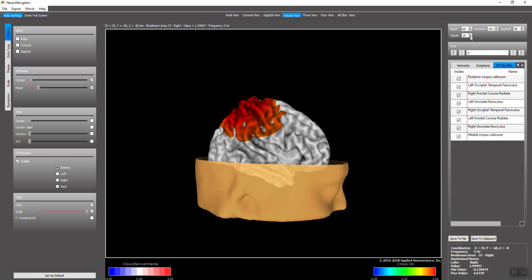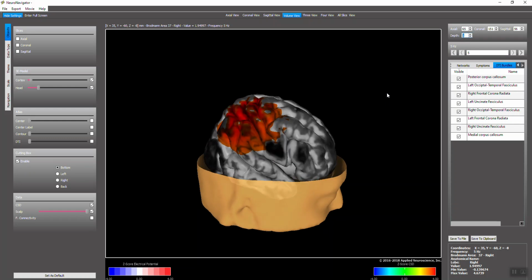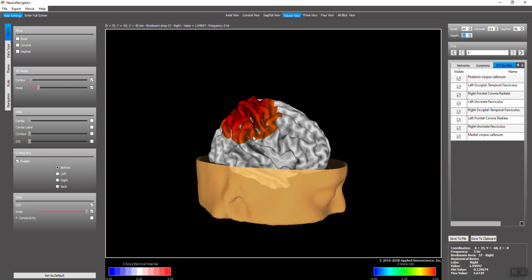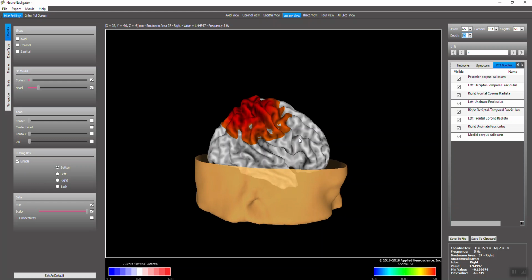We can change this to go to the, that's deep in the brain. We're going to go now to the surface. And you'll see it gets dark because there's dura, there's no electrical potentials there. I'm going to go back down to the deeper parts of the cortex, and there's 10 steps you can go through to see that.